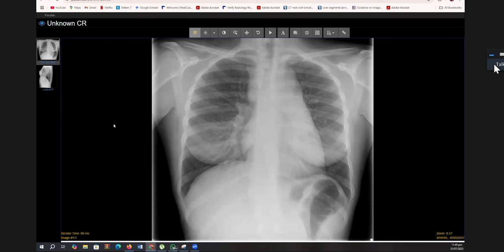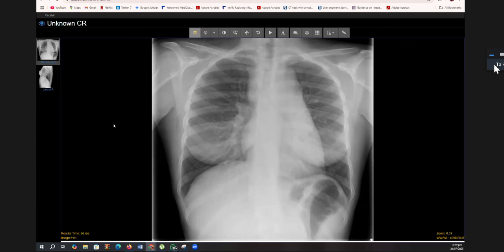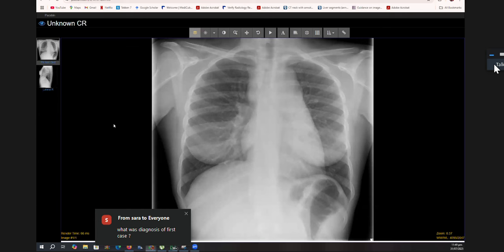So I'm presented with a chest X-ray, frontal projection of a skeletally mature patient. In this X-ray, the first obvious abnormality I can appreciate is mediastinal widening. There is bilateral paratracheal soft tissue opacification with lobulation in the aortopulmonary window, and widening of the right paratracheal stripe is seen as well. Bilateral hila in this given projection are unremarkable, and I would now comment on the rest of the bilateral lung fields, which are grossly clear.